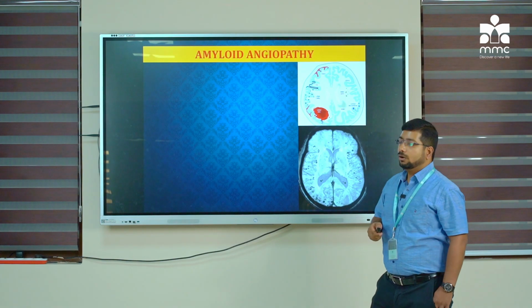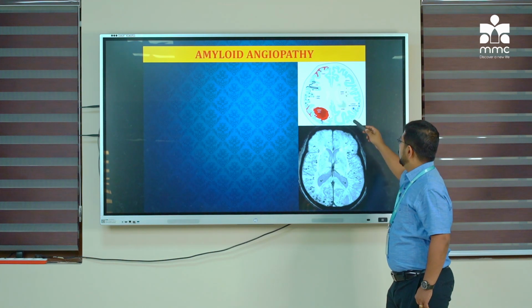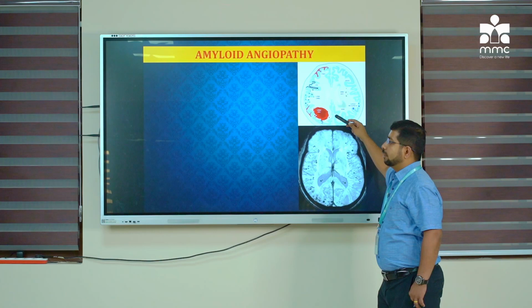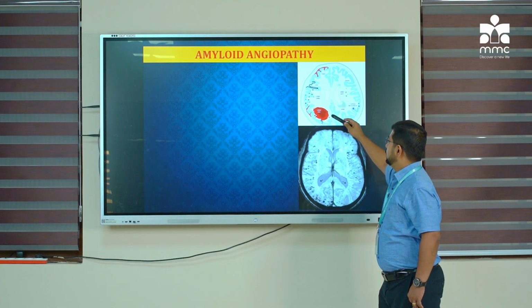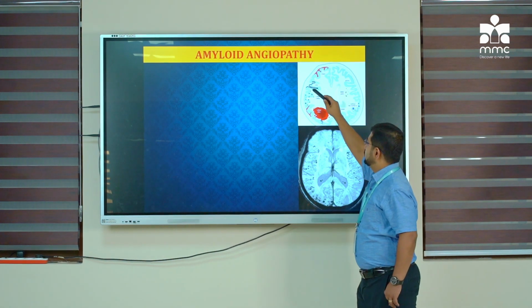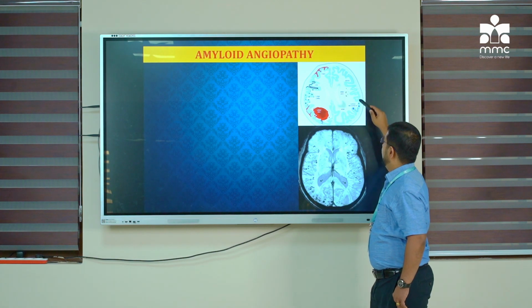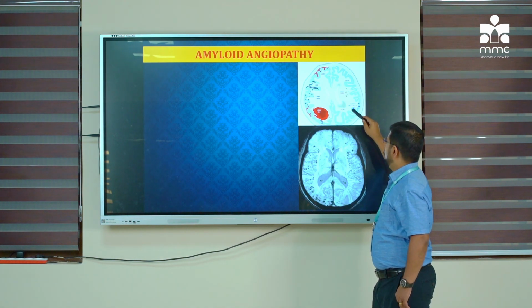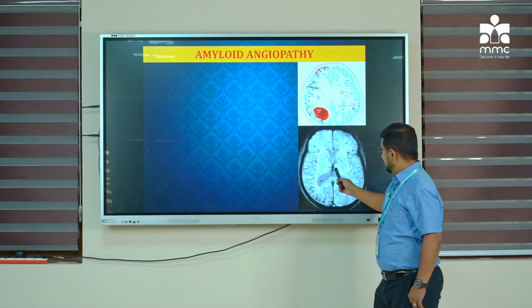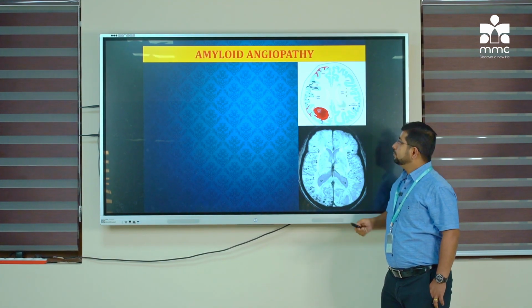There is something called amyloid angiopathy. We usually differentiate it from hypertensive angiopathy in the sense that the basal ganglia, cerebellum, all those things will be spared. Instead, there will be hemorrhages in the brain parenchyma itself, and there will be subarachnoid hemorrhages. There will be a lot of small microhemorrhages in the brain parenchyma, cortical microinfarcts, and white matter changes, all those things. You can see this compared to the basal ganglia here. We can see a lot of dots in the cerebral parenchyma.